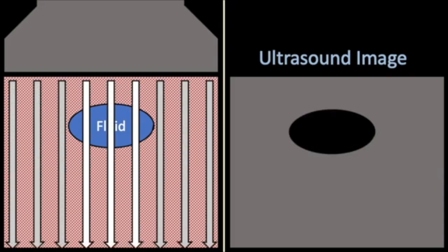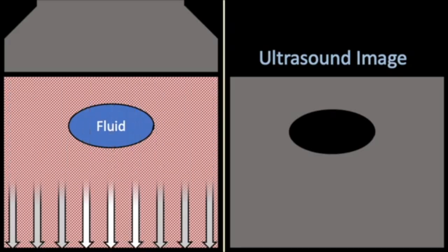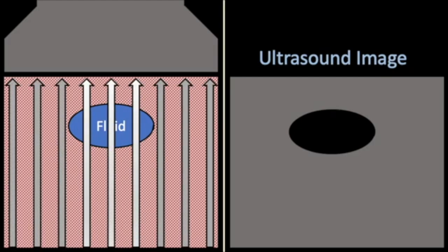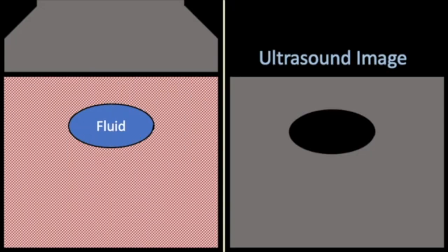Now, attenuation happens in the surrounding tissue as the beam goes deeper and deeper, but less so in the fluid collection, so that the beams that return through the fluid collection have less attenuation of their sound, and therefore appear as if there's posterior acoustic enhancement.